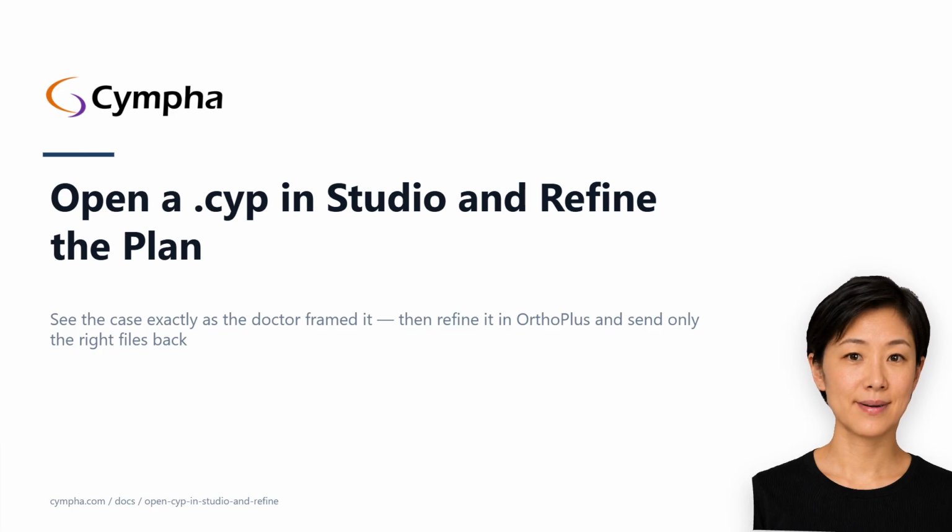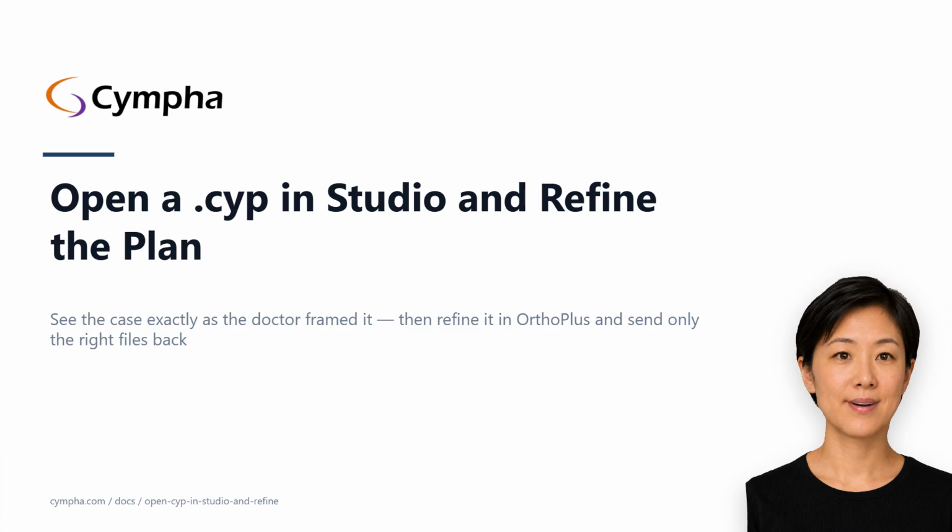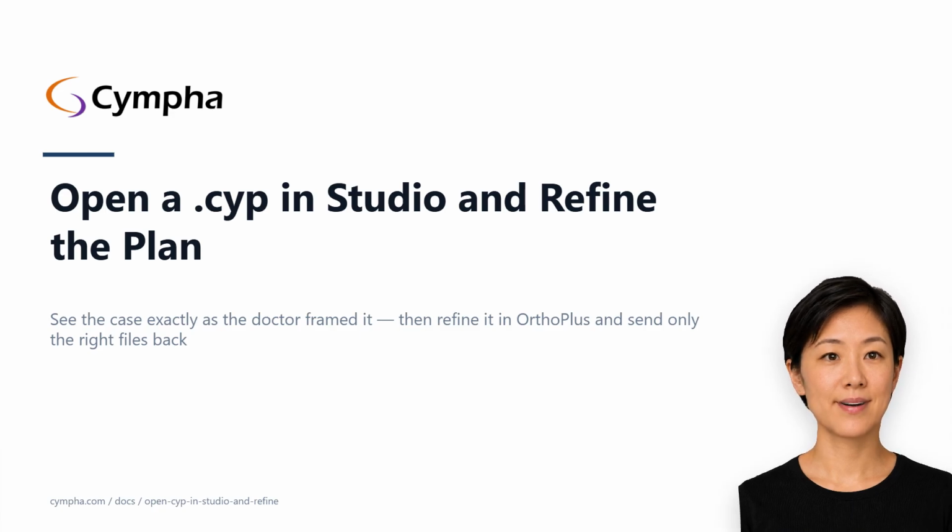By the end you'll know where the project file lands on disk, how to open it in Cympha Studio, how to read the view you inherited, how to switch into OrthoPlus for the actual tooth movement, and which files travel back to the cloud when you're done. About 8 minutes the first time, 2 minutes per case once the round trip feels natural. Follow along, or listen now and read later.